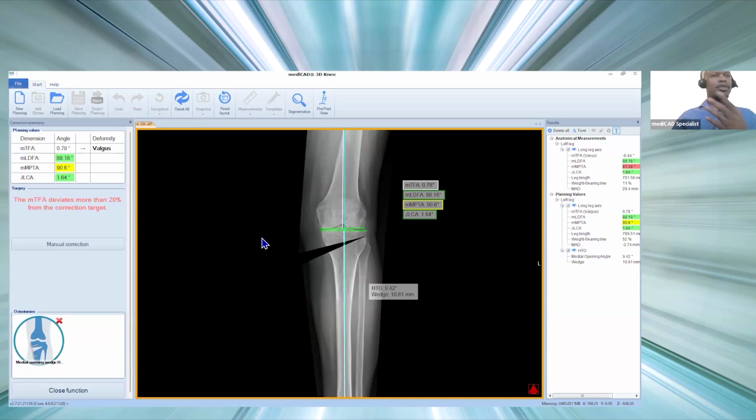This is something that, when I speak to surgeons and show this presentation, they explain to me how long it takes them to do this. They see how fast our software can do this osteotomy with that much accuracy, and that they can also use their expertise to do it the way they want, based on their preference. They're always amazed with the software.